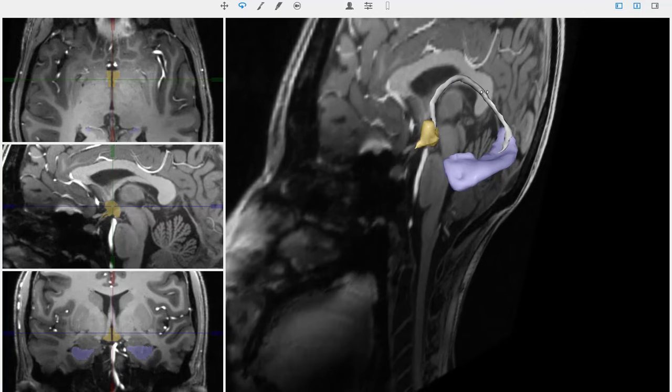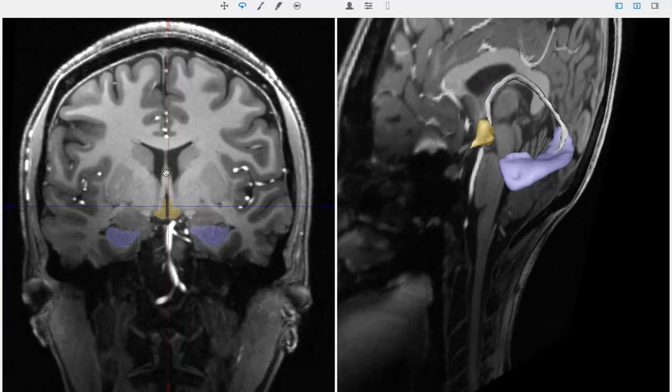So we have corpus callosum as that large white matter strip connecting right and left hemispheres. Then we have lateral ventricles, and then we have the fornix wrapping around. This coronal slice is a nice place to look at all the different white matter structures. So corpus callosum is a commissural tract connecting the right and the left hemisphere. The internal capsule is a projection tract going from the brain down to the spinal cord and back up to the brain. And the fornix is an association tract.